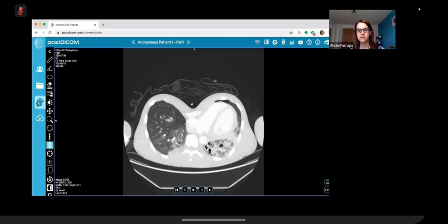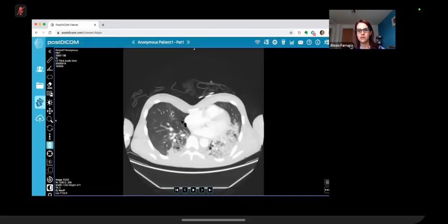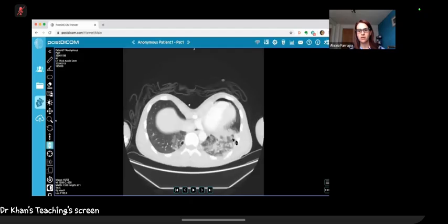These cystic spaces represent post-traumatic pneumatoceles. There are, as you said, extensive contusions and consolidations bilaterally. If you window it, there's no active hemorrhage into this region. But as you said, the predominant lobe involved by this injury, this chest trauma, is the left lower lobe.